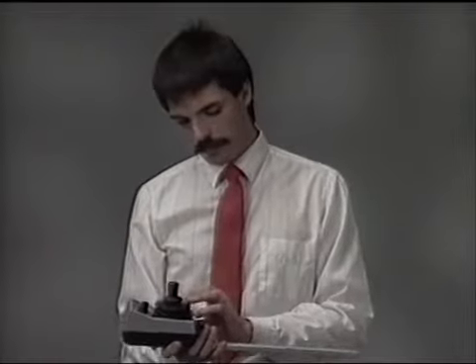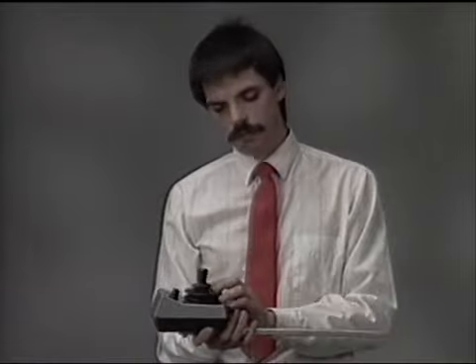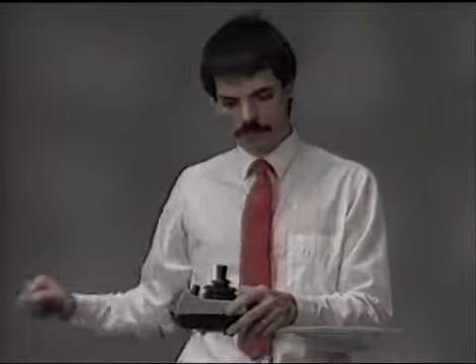Now, for some individuals, a joystick like this will be very difficult to operate because it uses fine motor control. Being able to push this forward and back and control where you are and the speed at which you're going takes a certain amount of hand control. Those individuals who have athetoid or spastic movements, meaning very rapid movements from side to side, would have a tough time operating this. They would grab hold of it, push it all the way forward, and then head off through the wall or damage something in front of them. So we look at a different type of control for them.